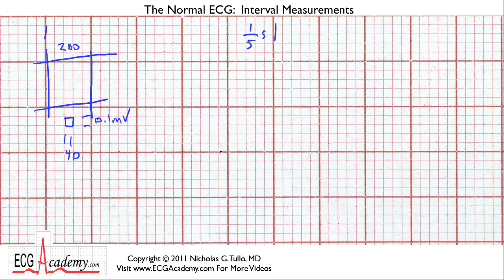If you recall, the atrial depolarization gives you a small bump known as a P wave. Ventricular depolarization results in a QRS complex. And then there's always a relaxation wave known as the T wave. So that's the QRS, and here's the T wave. Other parts that we need to be concerned about: the PR segment, which is the part between the P and the QRS complex.